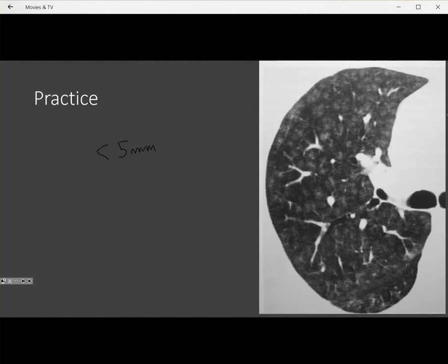One of the first things we could do is just look at the appearance, and we note that these are ground glass nodules. That in and of itself is going to be a pretty big clue. We said that the only micronodule distribution that can be ground glass is typically centrilobular. So that should be a pretty big clue as to what we're looking at. But let's see if we can apply this algorithmic approach, and let's see if that holds true.